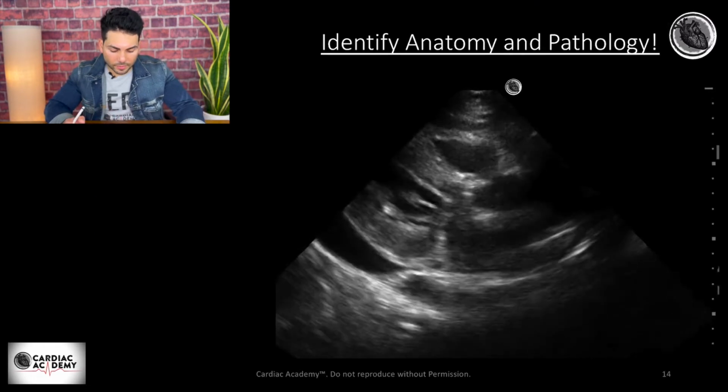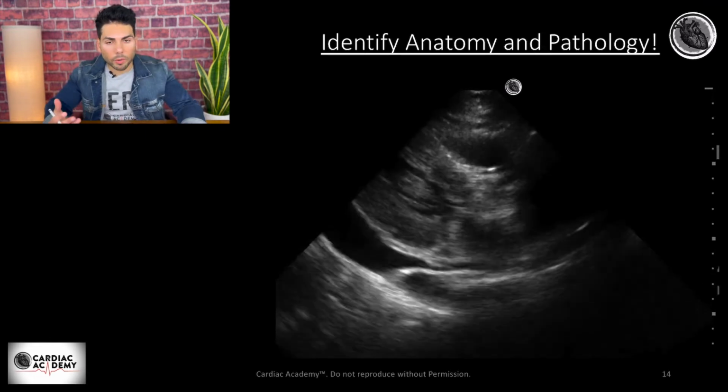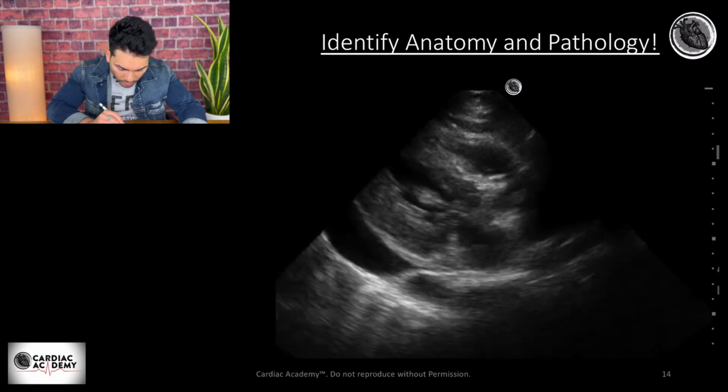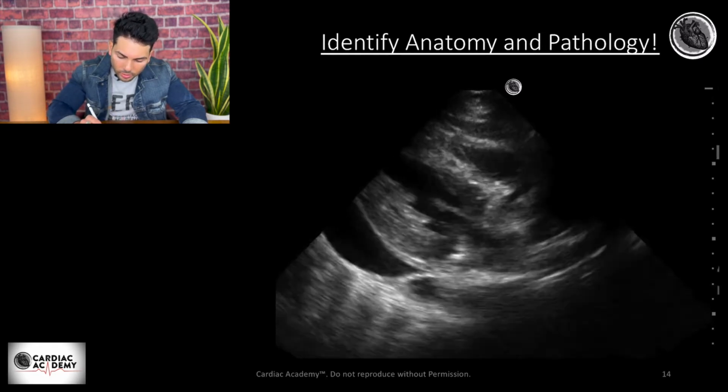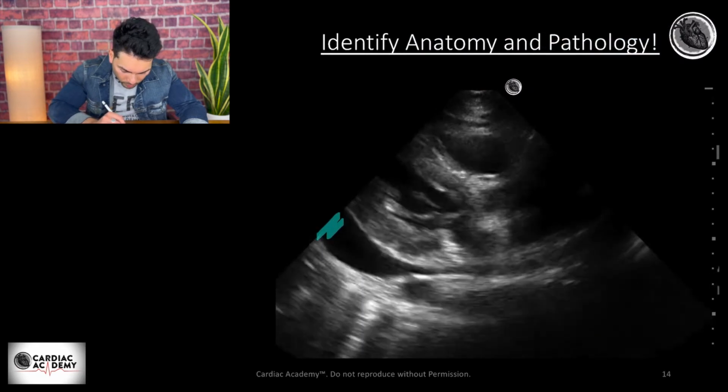Another example. Again, we look and we see some fluid, right? We see some fluid around the heart. And we can see some fluid here. Let me change color to make it easier for us. So I'm gonna choose blue here. We see some fluid here.